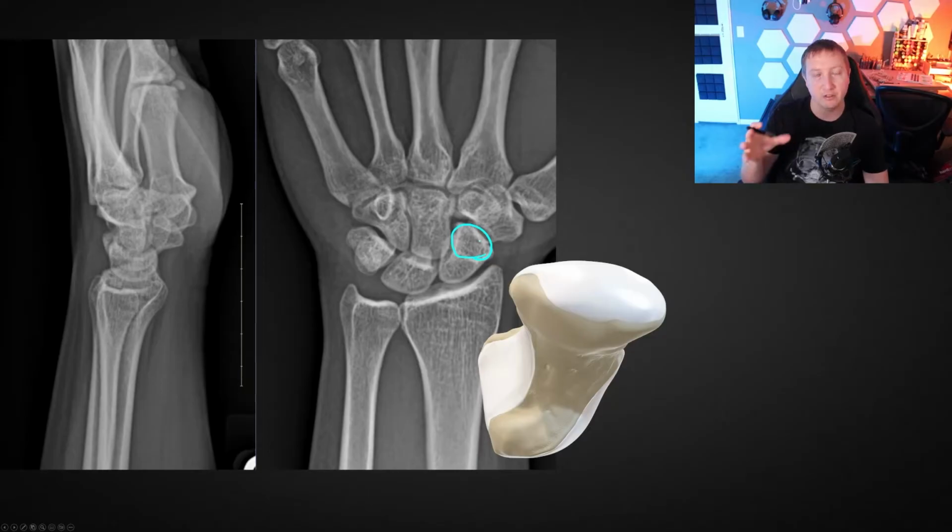And so the more ring-like it looks, of course, the more down the shaft of it you're looking, if you will. And so that actually can be concerning in some cases if it's abnormally tilted. But in this case, it looks normal, and we can always correlate that on the lateral. And then look at the angle between the scaphoid and the lunate.